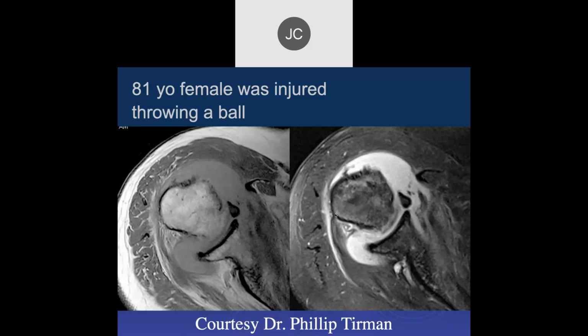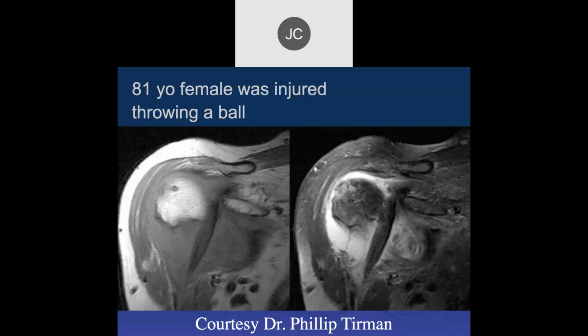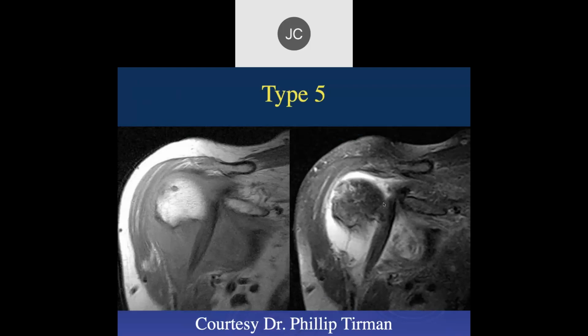Okay, so we have an effusion. I see. Do we have a subscap tear? And again, is that medial subluxation? Right. So this is again a 5.